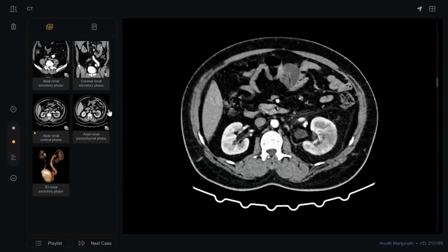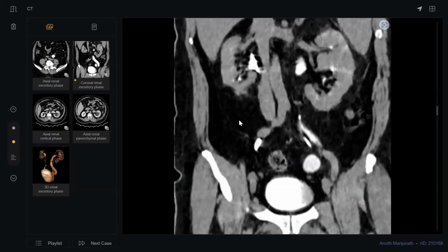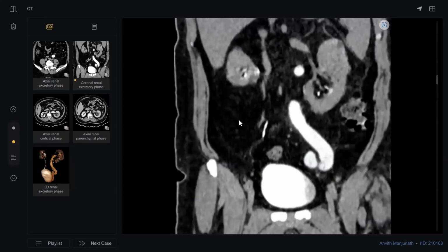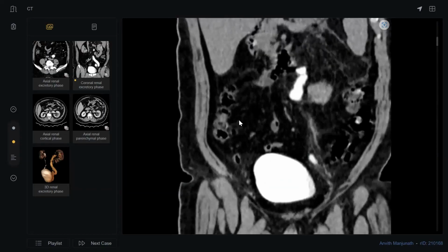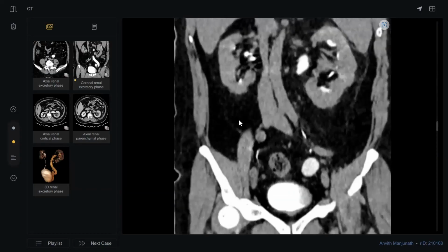Okay. Third point, you didn't ask me. You told me I want a coronal, but fortunately, this coronal was in the excretory phase. Yes, lucky, sir. You'd better ask me, doctor, please, could you give me the excretory phase? Okay. It's better to be asked like this.